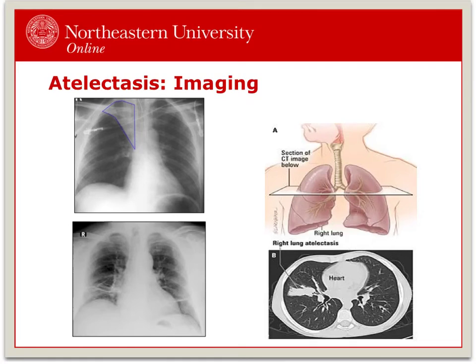Atelectasis is collapsing of the alveoli. This is a normal occurrence with inactivity and post-surgery, but it could also be a precursor to pneumonia. The image findings on image 1 show right upper lobe atelectasis noticed by the opacity.